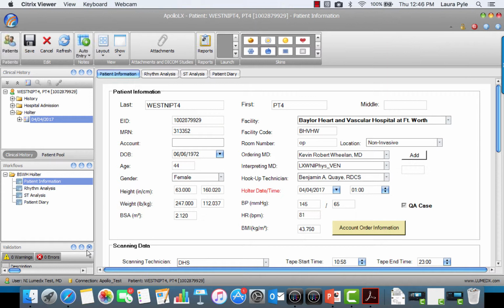You can work with panes in the following ways. You can remove them, you can restore them if they are closed, and you can save them in a newly configured layout that you have made.